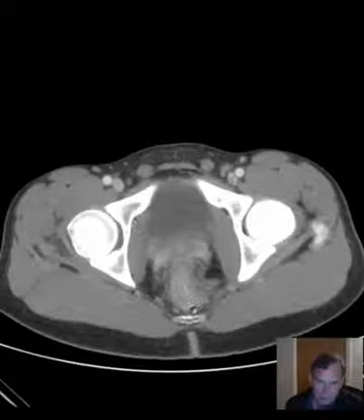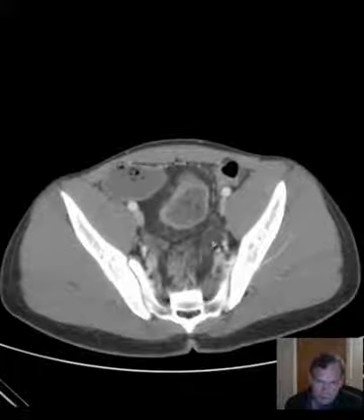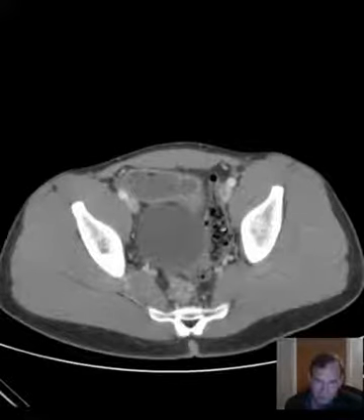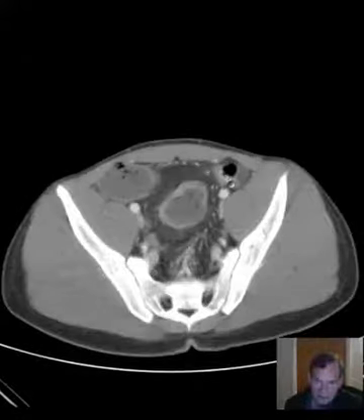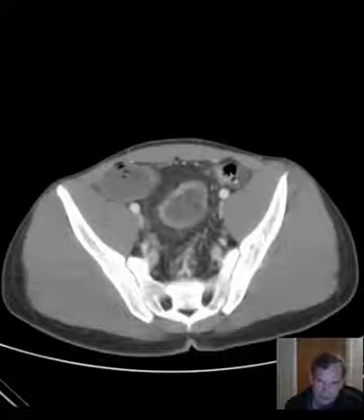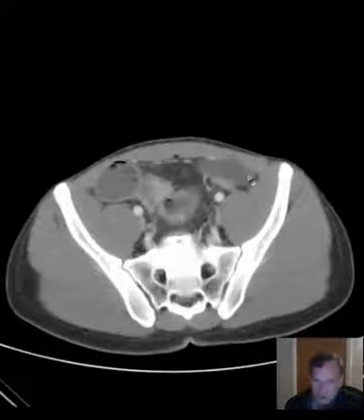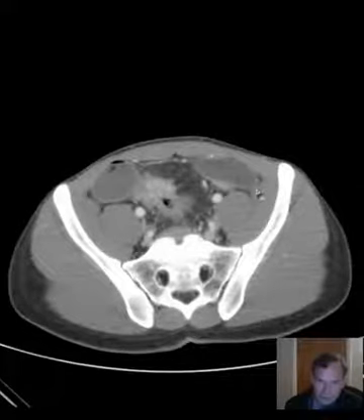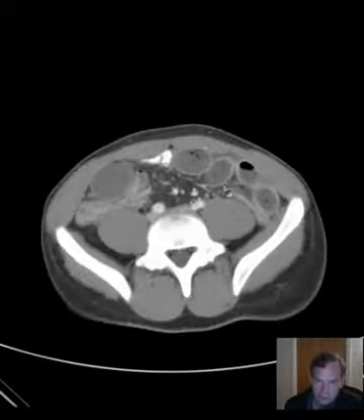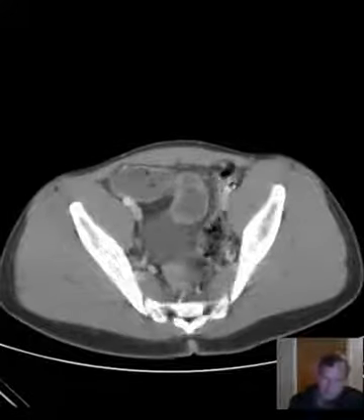But now if we begin from below, we look here, and here is rectum, and here is some sigmoid colon. So, okay, here we can see sigmoid colon with stool in it, and here you have a viscus which is air-filled, and that looks like the proximal sigmoid colon. So it joins that very small caliber left colon somewhere in this area. Here's the small caliber left colon, and there we go, and it connects right there.